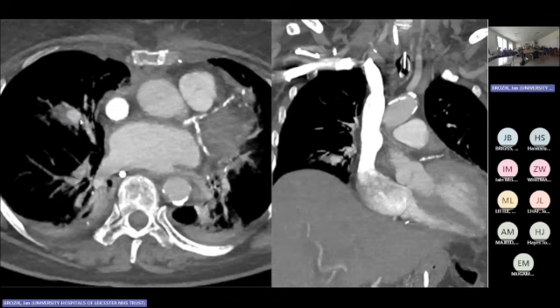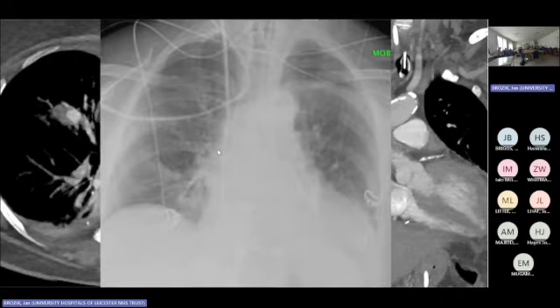And we shouldn't have such a big vessel here, and it's just like that. It's a pseudo-aneurysm. Why do they have a pseudo-aneurysm? CT can't tell, but when you review the chest X-ray, the answer is simple. Yeah, the PA catheter went too deep and injured the pulmonary artery. This is an elderly patient, and I recently checked their imaging.